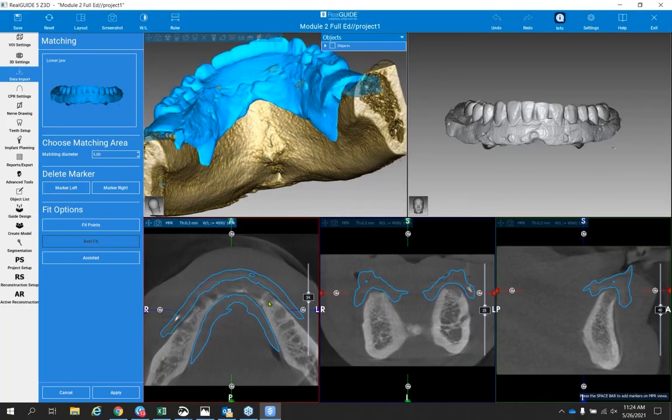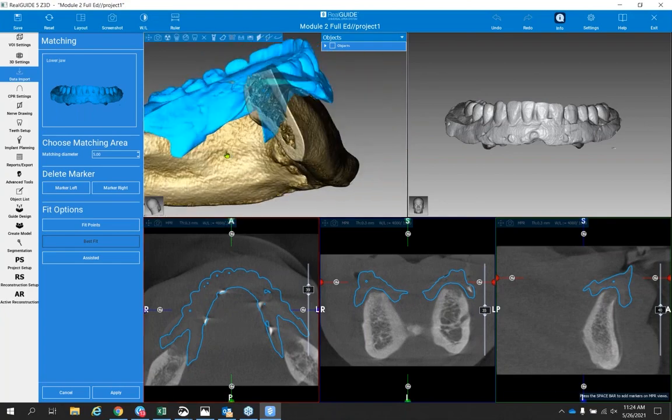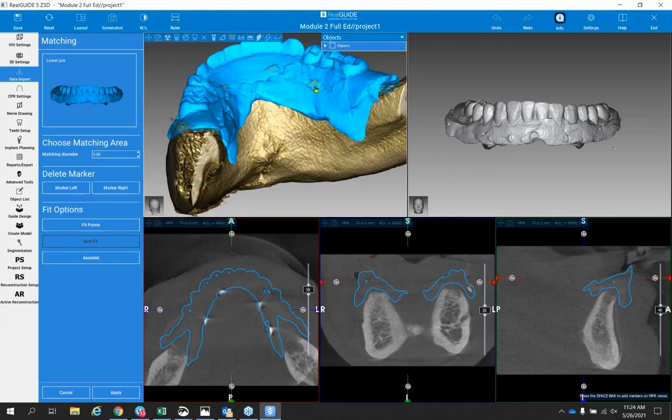So as we come, looking for mandibular markers, there's one over here on the right. Right, I'm a little higher now. There we go. There's the 4 going around the mandibular of our denture. Now they're covered up with the fresh material. There's a marker there. There's one there. And I can just see that they're in the right place. We can see it there.